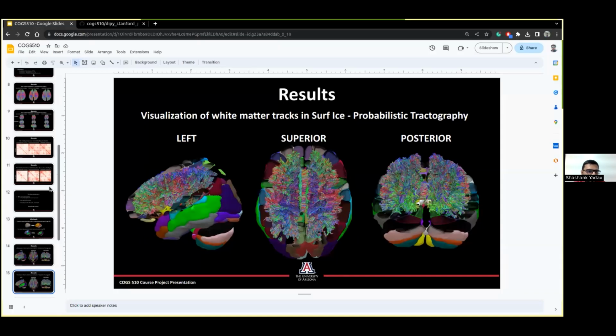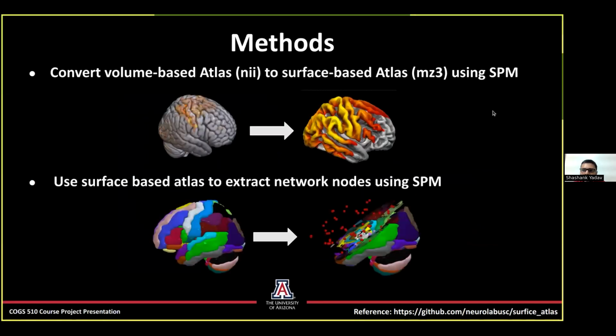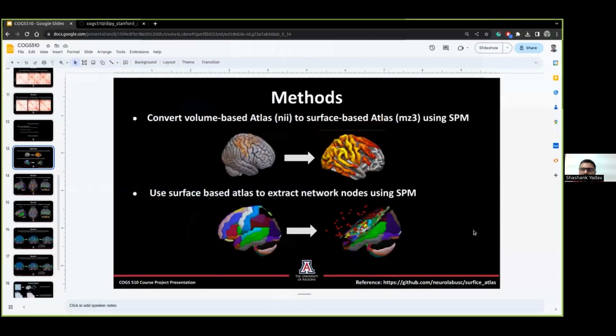Yeah, so I'm back again because my Zoom died midway. So we'll resume our tutorial. Let's go and see. We were here, and I was trying to show you how to do this. Let me go to slideshow. So it's trying to show you how you use Surf Ice for track visualization. And then I think if I just stop share and then again go to Surf Ice.